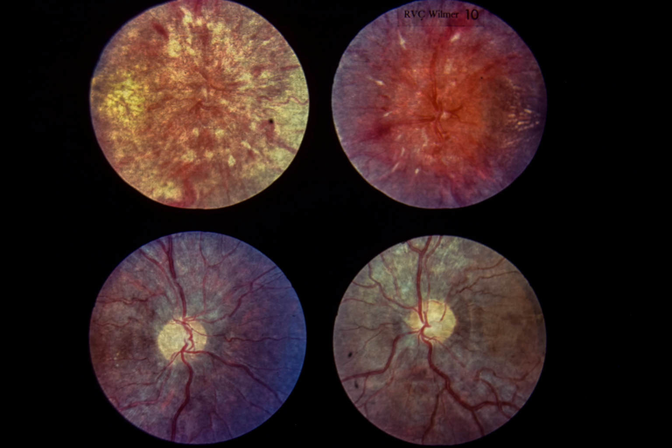The neurologic examination was normal. Cerebral angiography and pneumoencephalography failed to demonstrate an intracranial mass. The ventricles were small. Lumbar puncture revealed an opening CSF pressure of 450 millimeters of water. A diagnosis of pseudotumor cerebri was made, and the patient was treated with systemic steroids for 5 months. Lower left and lower right. 6 months after completion of the course of steroids, the discs are normal, and the patient has no visual deficit.